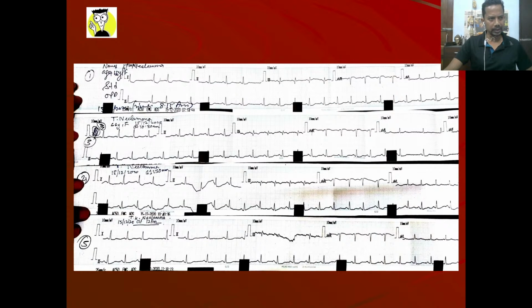So this is the patient's ECG, which we have, this patient right now also, and it was admitted by another doctor. I think the JR had admitted, and he said, sir, the patient has ischemic changes, has come with ischemia, so we have admitted as ischemia, so please see the patient. And we were on call, so we saw the patient. Okay, so this is the first ECG. I saw this ECG. I said this is inferior wall MI with posterior wall MI, and we should thrombolyse. And they were a little wary, and they thought why I am saying this, there is no MI. But then I said you take the ECG every 15 to 30 minutes, and TROP-T was negative.